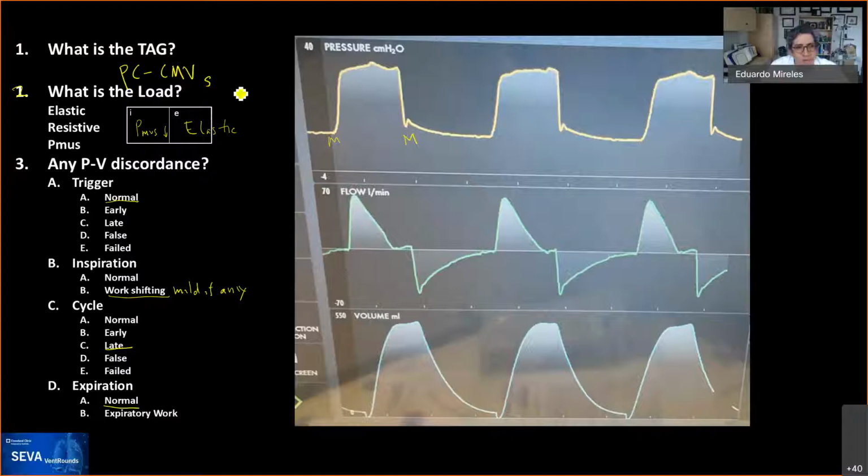So it's pressure control. This pause that you mentioned down here, can you do that on volume control? Can you get a pause at the end of the breath? You can, but you wouldn't see another increase in flow there. Exactly. But you can add a short pause or however long you want. Yeah, excellent.